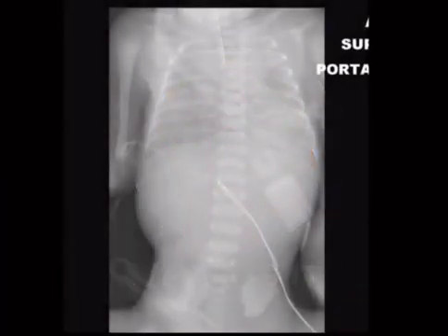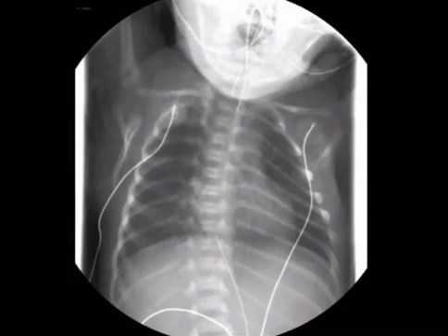All right, next case here. This is a classic gamesmanship here. A, notice the abdomen is gasless. B, let's take a look at this tube up here. All right, so give me another example. That'll work too. So what I'm trying to show you is the enteric tube that's sort of stuck up high.